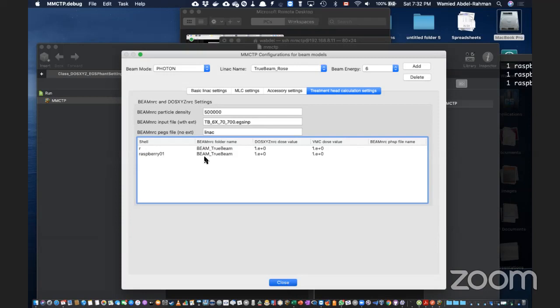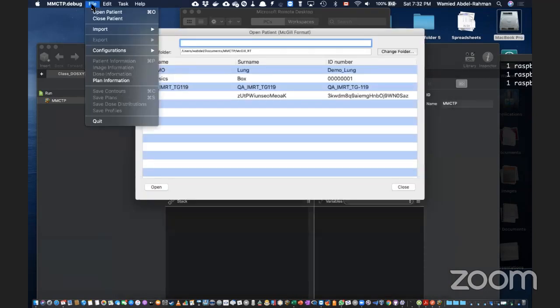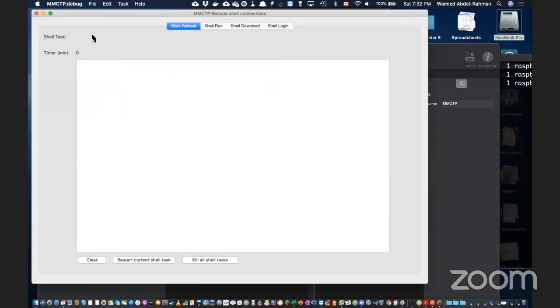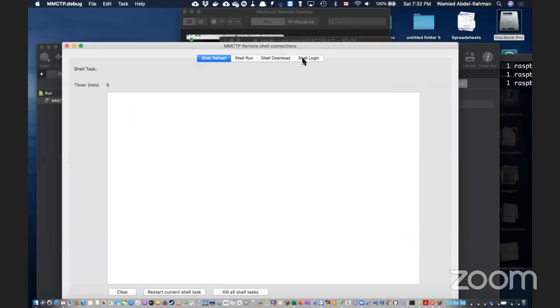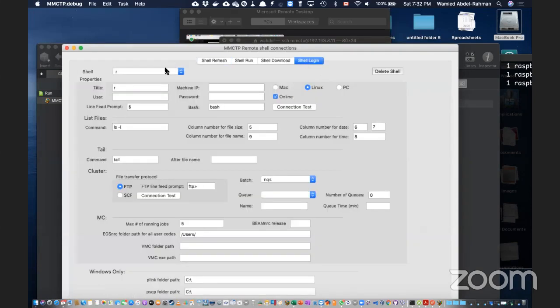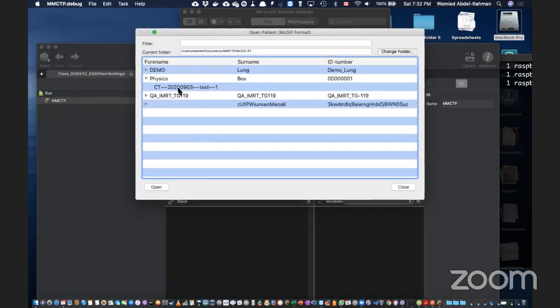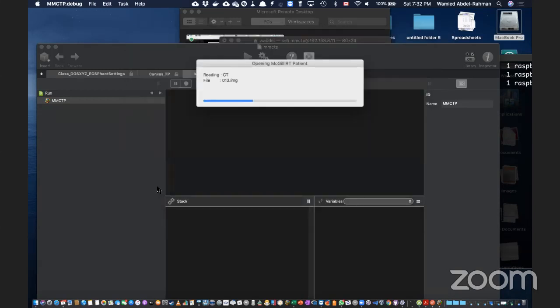So we're done. Here I have two because I think there are two shells, so let me clear this shell again. Yeah, this one I'm going to delete. Okay, so I have one left instead. I'm struggling with this patient, but let me show you what I want to do.